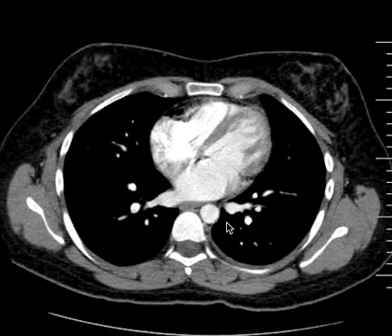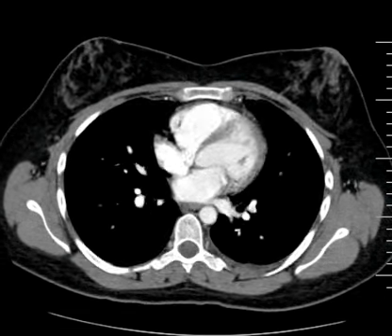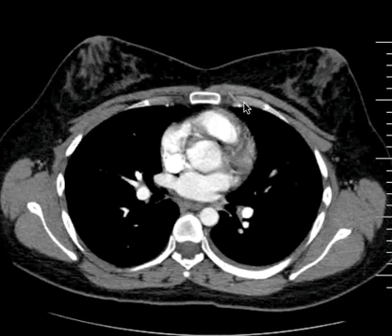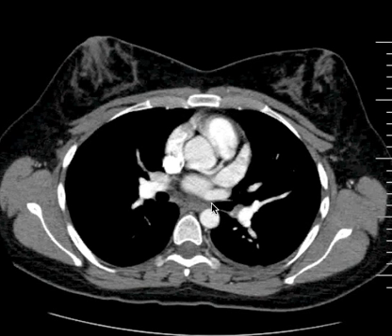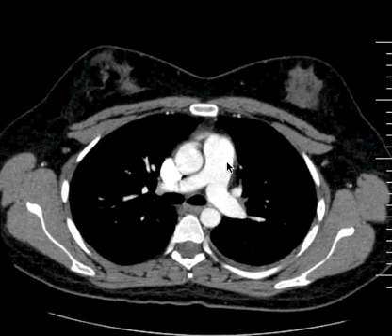So let's look here in the right ventricle then, and we know that at this point the main pulmonary outflow tract should be what we're going to encounter next. And although we don't see the valve itself, we're here beyond the valve in the main pulmonary artery. And the main pulmonary artery branches, bifurcates, divides under the aortic arch, and you're not going to get a prettier view of it than that. Ascending aorta, descending aorta, main pulmonary artery branching into right and left main pulmonary arteries.